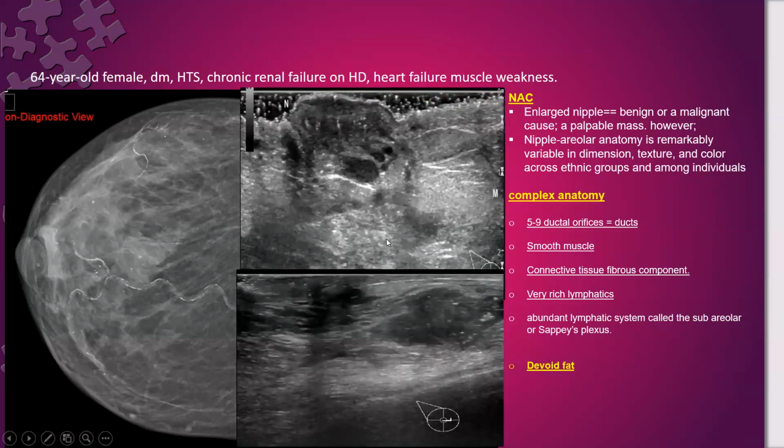And this is the nipple. Look for the nipple. The calcification is there. Not only the calcification, it is enlarged, it is distorted. Look for these ducts and look far away. You look for this lobulated asymmetry.